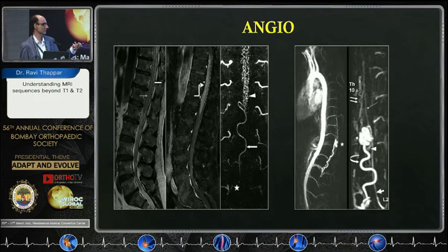And I am about to finish. And this is another different case where there is a spinal cord AVM and you can see the draining vein again. So what this angio does is it gives a roadmap to the interventional radiologist, who then can go in and cannulate the specific vessel and directly get on with the therapeutic embolization. He does not have to waste time doing diagnostic angiograms. So that shortens the table time and the contrast requirement.